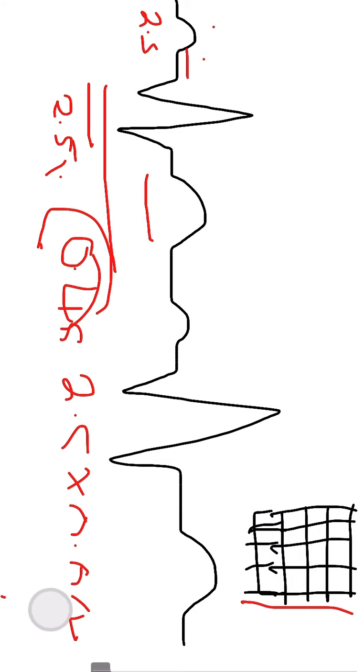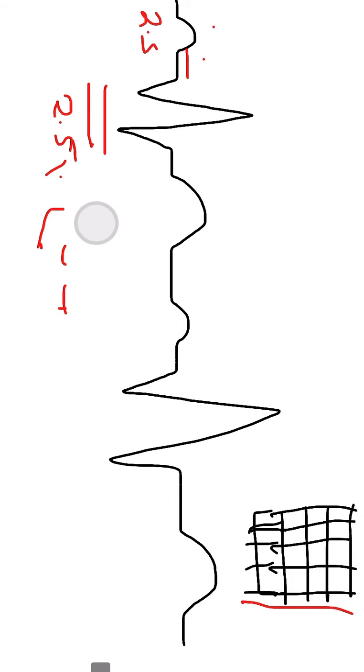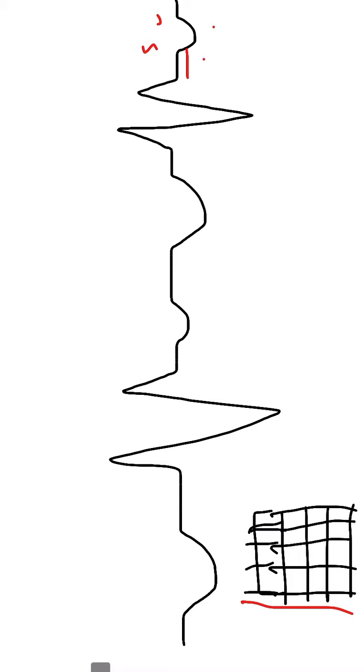Awesome. So in order for us to calculate the heartbeat, we see what is going on in the RR interval. Why the RR interval? Because usually this is the space between the heartbeat. Everything that is due to an impulse has happened in this area.